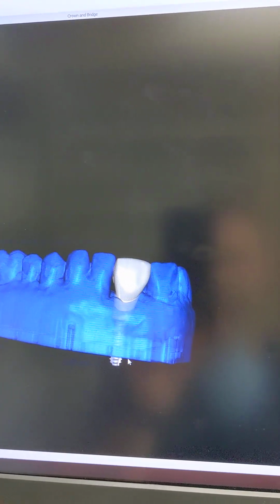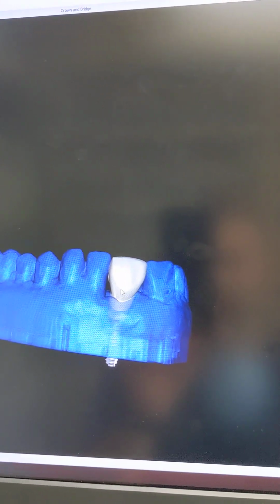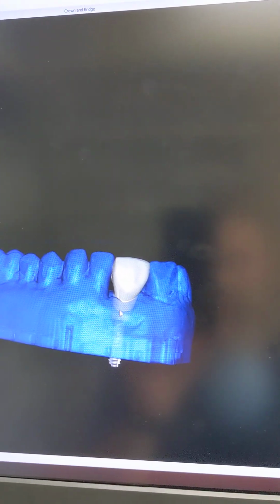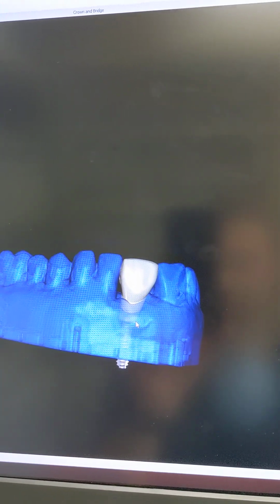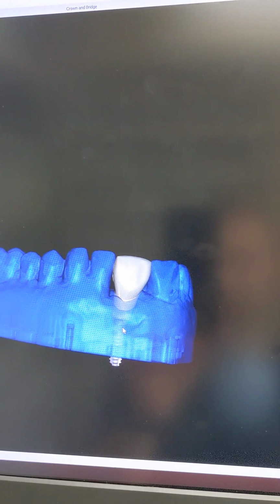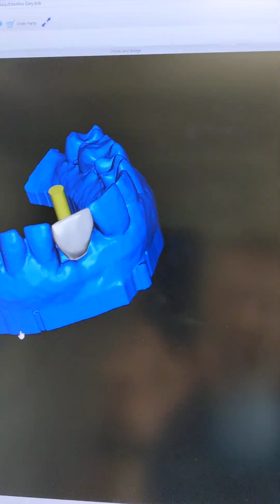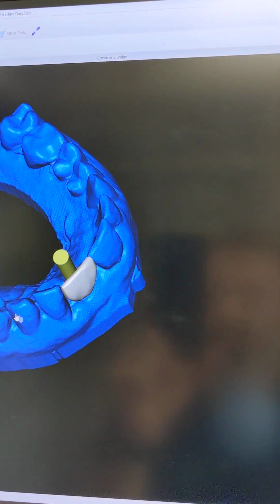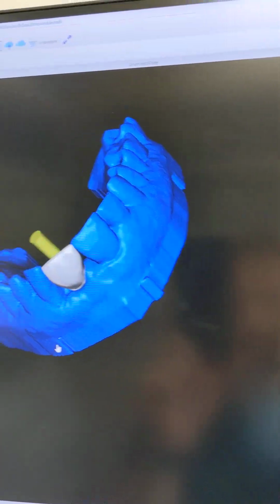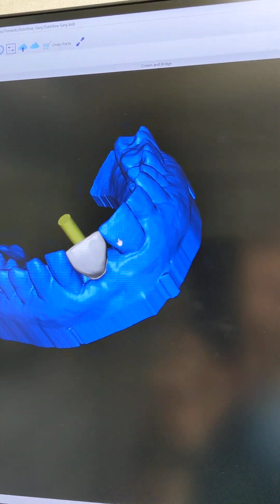But the trick was basically selecting an implant that had a base in there, and obviously I'd already generated my surgical guide and everything off my correct implant. I just swapped this out, resaved it as a different one, so this one still has my traditional implant in it, my BioHorizons implant, and then I just have the one that was the temp generation, so I can go in and edit that whenever I need to. That was my workaround. Let me know what you guys think.